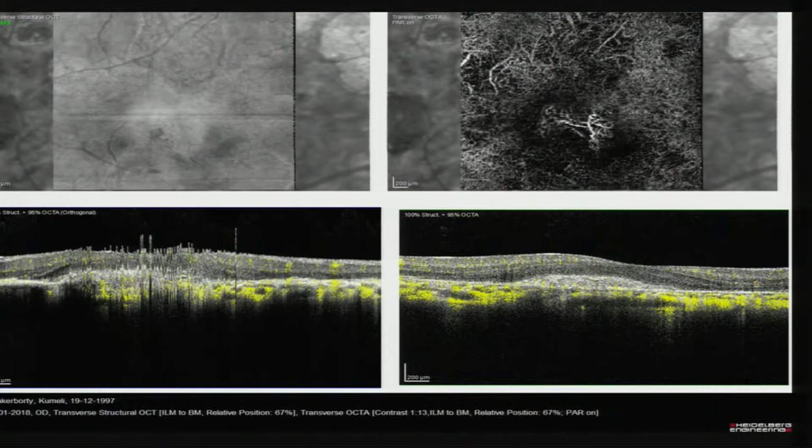Yes. The decision on treating was definitely helped by OCT angio, but I think you also gave a lot of weightage to her symptoms, like in a myopic CNVM. Many a times we don't see anything objectively. We give a lot of importance to a patient who is very wise, and he says that since last week I am getting metamorphopsia, and we tend to treat. So did you give equal weightage to her symptoms? And what I mean is, suppose you had seen this and the patient had no symptoms, would you treat that, or did you give 50% importance to the symptom also?